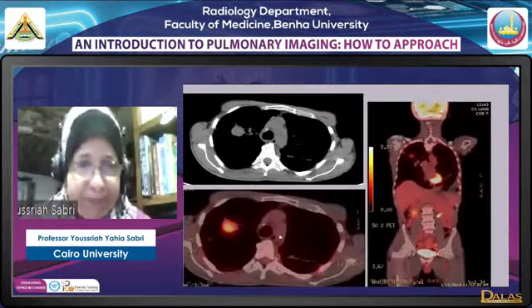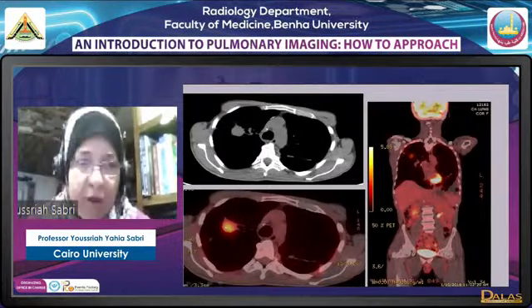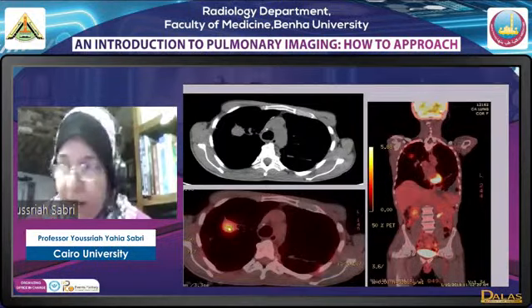PET CT was done, and as you can see here, part of it has hypermetabolic activity, had tracer uptake.